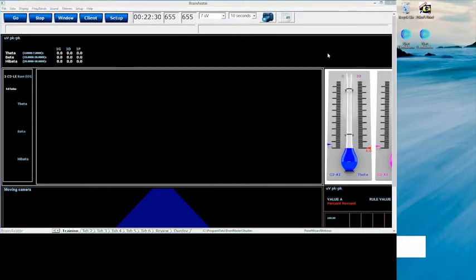So if you have a resolution like this and you want it to look exactly how I had it before, now we got to utilize what we call our Panel Wizard system. The Panel Wizard was built in because a lot of people didn't like how things were laid out in the software. The way the software used to work in the 3.0 and Discovery series, and even in the early BrainAvatar software, is it would stack all panels on top of each other. So it would go raw EEG, then training EEG, then thermometers, and then event graph, and it would just stack them on top of each other, which gave you a whole big giant screen that you would just scroll down.